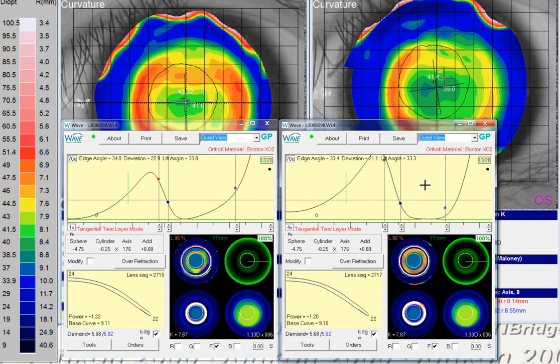So now in this range of 8 out to maybe 9.5 millimeters or so, we should be touching on the cornea, whereas out here we're anywhere from 8 to 12 microns of clearance. If we go out to the HVID around 11.2, we can see that we still have quite a bit of clearance there, and that's to avoid the limbus. So I don't think this lens will land on the limbus too much. It should just be landing on the cornea.